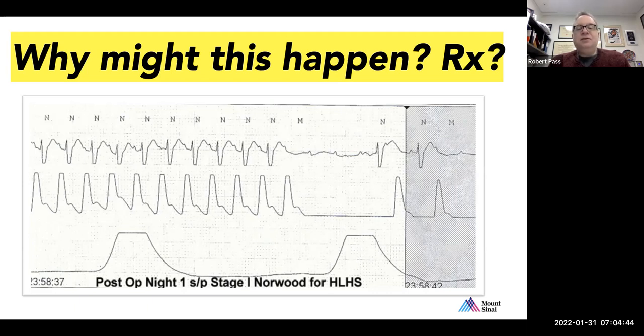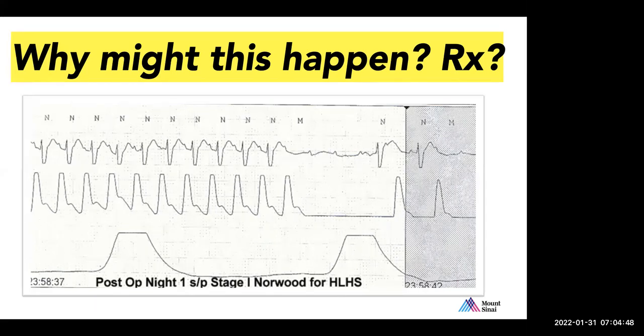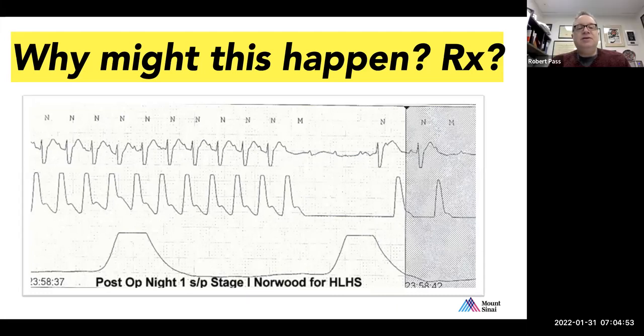So is it third degree heart block? In third degree, there will be no association between the P wave and the QRS. That's right. There would be complete dissociation, and no P waves would conduct, but it certainly seems as if the P wave is conducting on these first 10 beats or so.